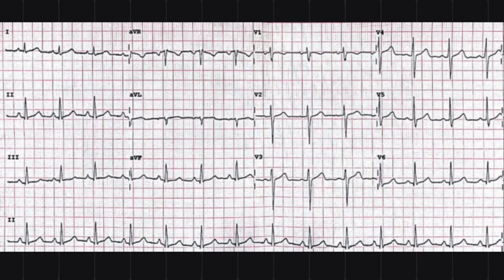Let's do a quick revision by solving an ECG. Here, the rhythm is regular, since the RR interval is constant at 4 large squares. The rate is 300 divided by 4, giving us a heart rate of 75. Both lead 1 and lead aVF have positive R waves, which shows a normal cardiac axis. Well, that was easy, right?